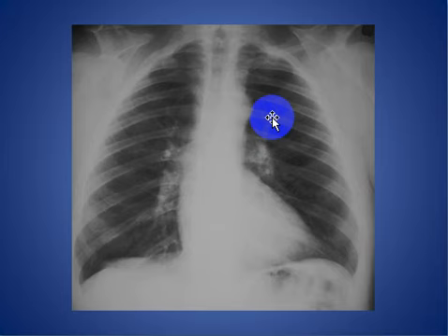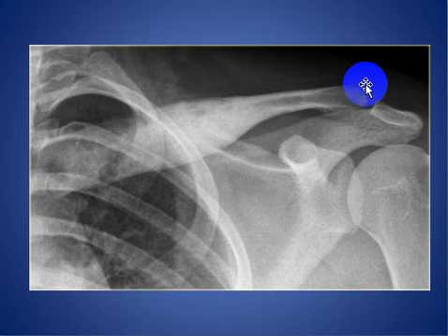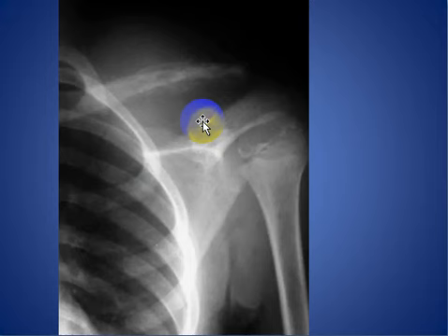Here, this is a patient with cleidocranial dysostosis, and we see absence of the right clavicle and hypoplasia of the left clavicle, as we see here. Here, this is a patient with a sclerotic clavicle, and this patient proved to have eosinophilic granuloma.